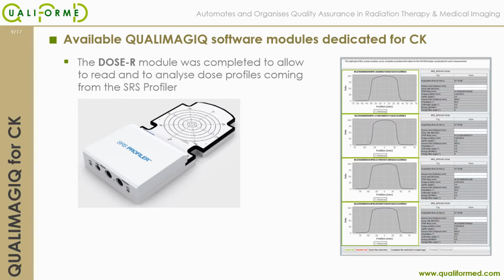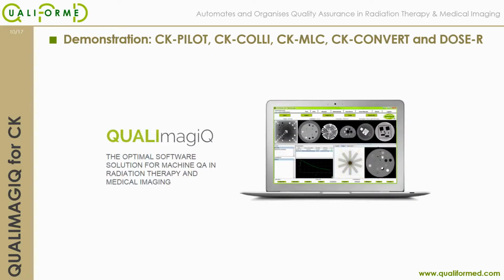I point out here that no particular development was required for the CYBERKNIFE, as this module was already available for use with classic external radiation machines. We will now begin the demonstration of QUALIMAGIQ and these modules dedicated for CYBERKNIFE machines.